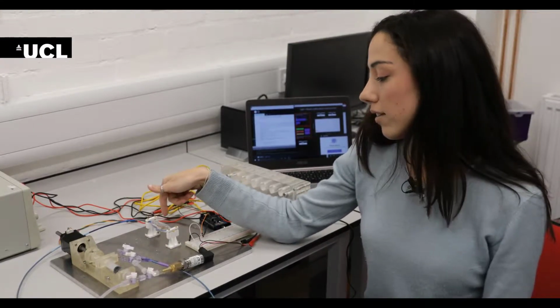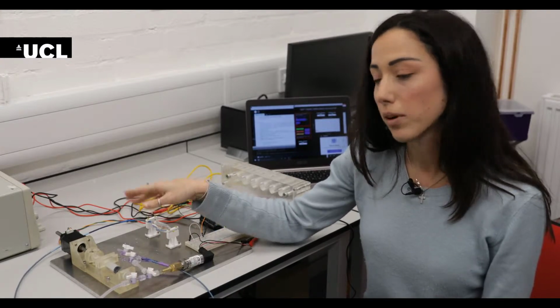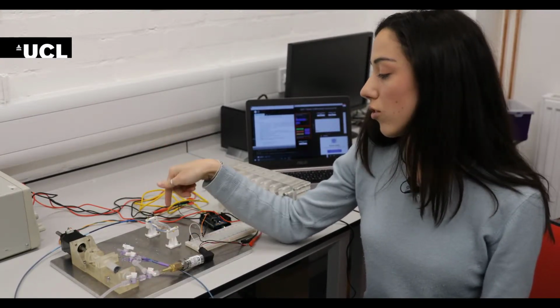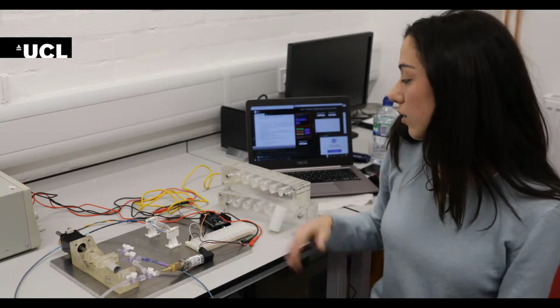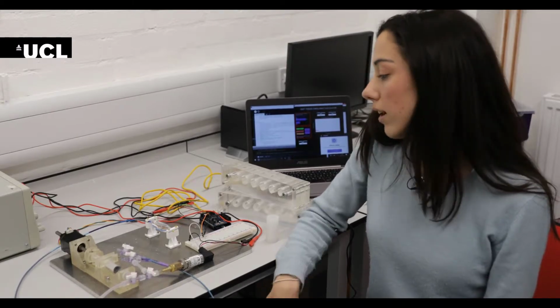I am now trying to interface a balloon catheter like this. Here we can see we have a balloon catheter and we are now monitoring the volume injected in the balloon with a syringe pump. We are also measuring the pressure inside the balloon catheter with a pressure sensor. We are going to inflate this device inside both rigid and compliant annuli to measure the geometry of the vessel and the compliance of the tissue.